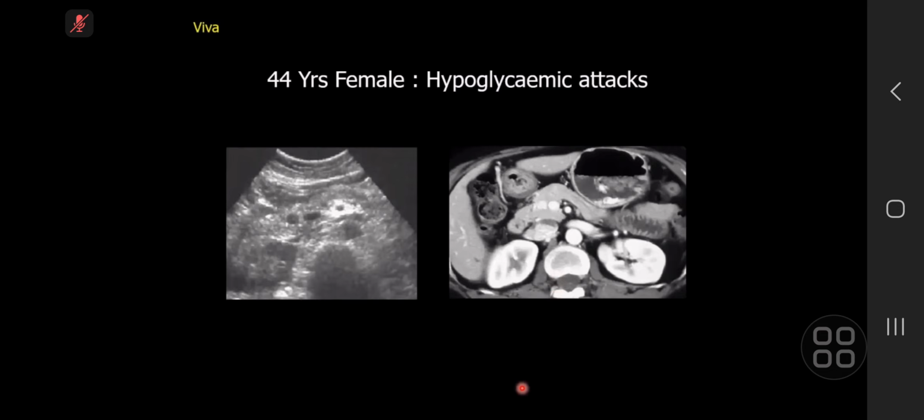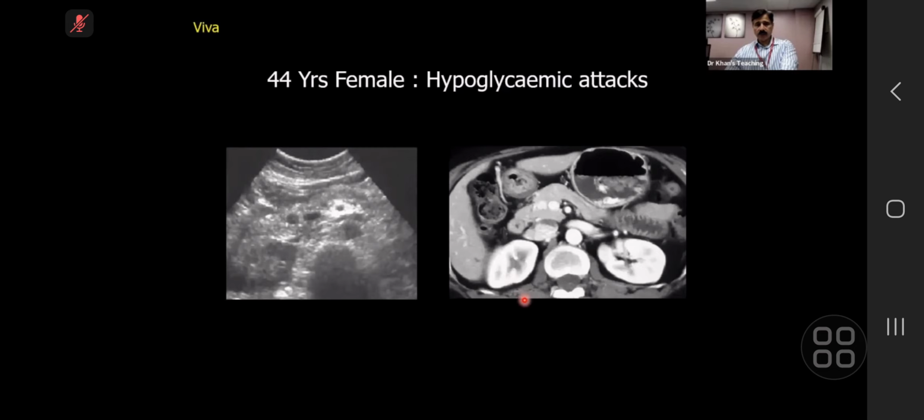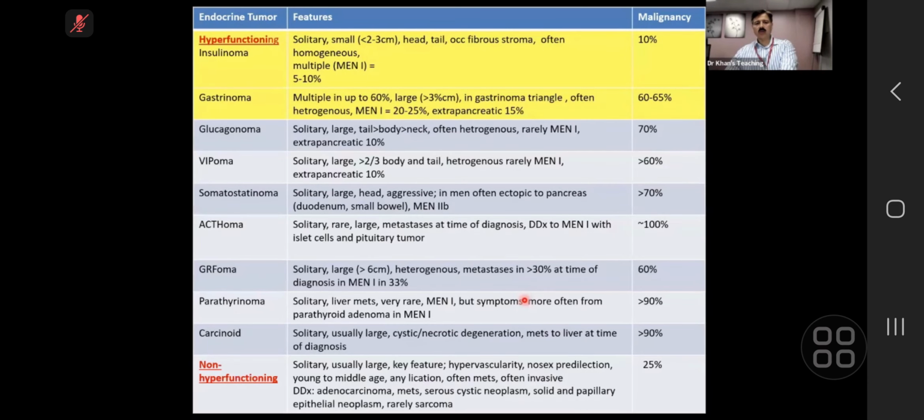So my conclusion will be a hypoechoic mass on ultrasound, which is showing contrast enhancement in the arterial phase in the pancreatic body. So it would be a hypervascular solid tumor, which in pancreas are most likely the islet cell tumors or the neuroendocrine tumors, which are hyper-enhancing. Excellent. So what we have learned from this case is that the two categories of tumor, one is what we call neuroendocrine tumors. They enhance. On the other hand, pancreatic carcinoma does not enhance.